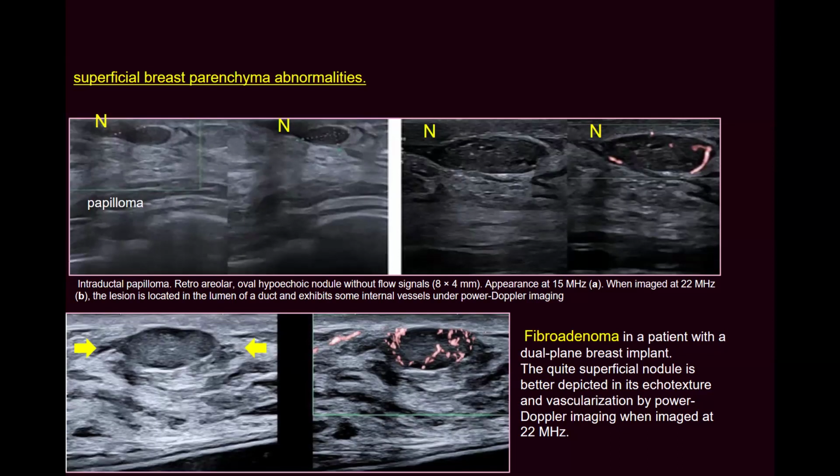So when we see a lesion obliquely oriented near the nipple, because those are coning like that, going in that direction, we consider it as parallel. For the same reason, here this is a papilloma very close to the nipple. It arises from the ductal system of the mammary zone, because the mammary zone reaches the nipple.